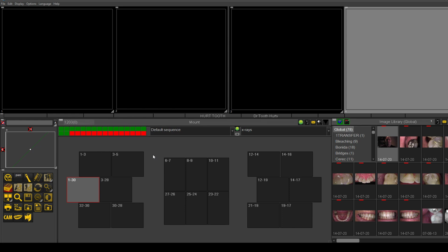Hi, Robert Beauchamp today to review with you the imaging software. We're going to be looking a little bit at the basic filtering tools within the software.